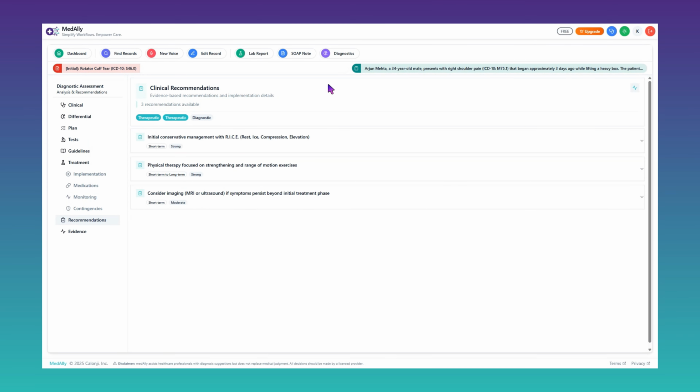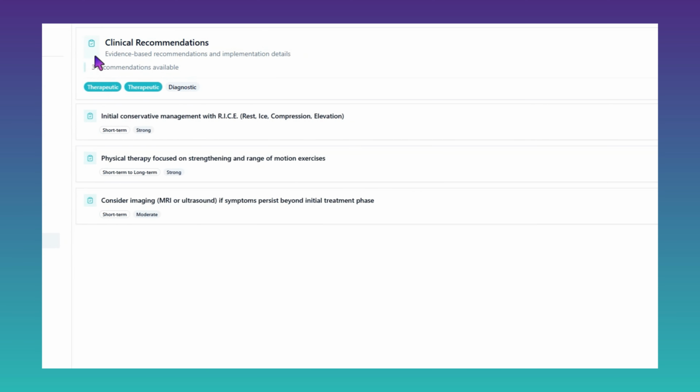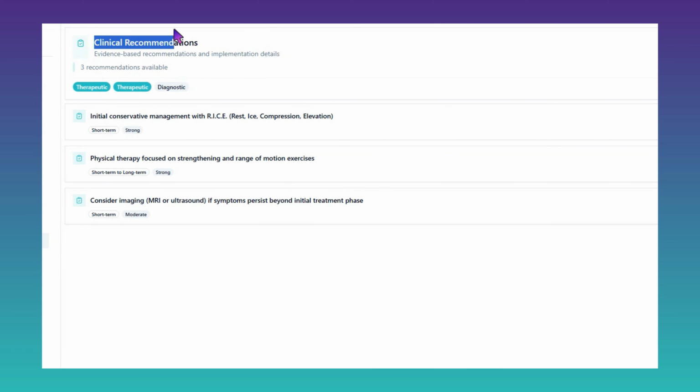Hi there. In this video, we will take you step by step through the MedAlly Diagnostix module. Let us move into the Recommendations tab under Diagnostic Assessment. This section helps you understand the evidence-based recommendations and the implementation details.